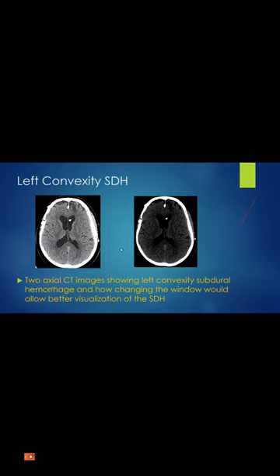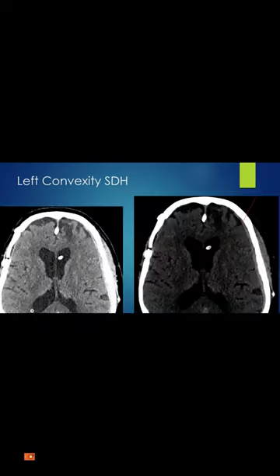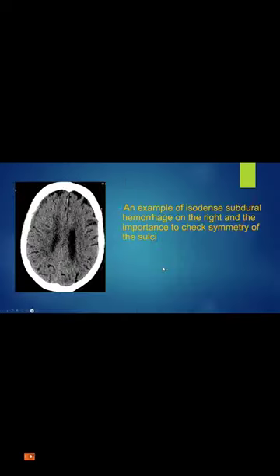So you might not be able to see that hemorrhage unless you do the appropriate windowing. And here, this is the magnified view, just to show the difference.